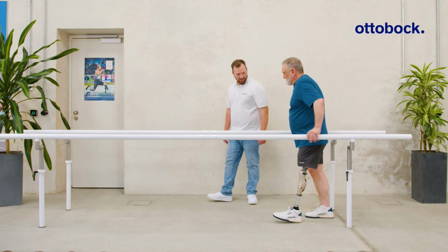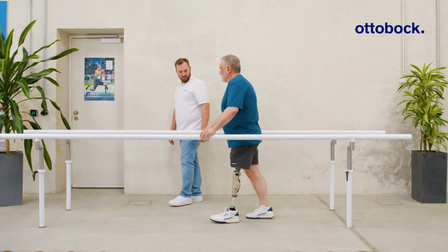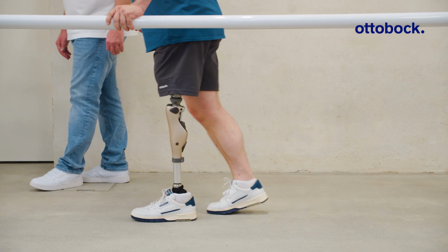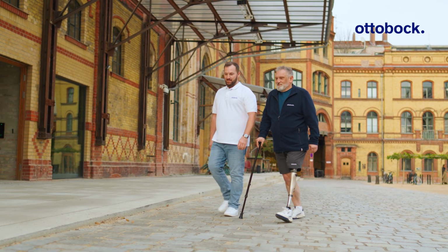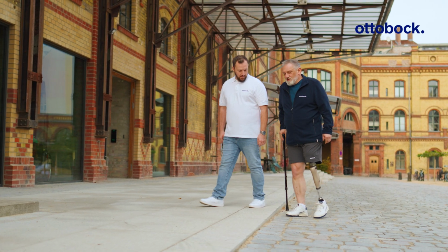Activity Mode B is particularly suited for users with moderate residual limb control. These users are able to walk step over step, but do not tolerate knee flexion during the stance phase. In this mode, stance release occurs late in the stance phase, providing enhanced safety during the transition from stance to swing.